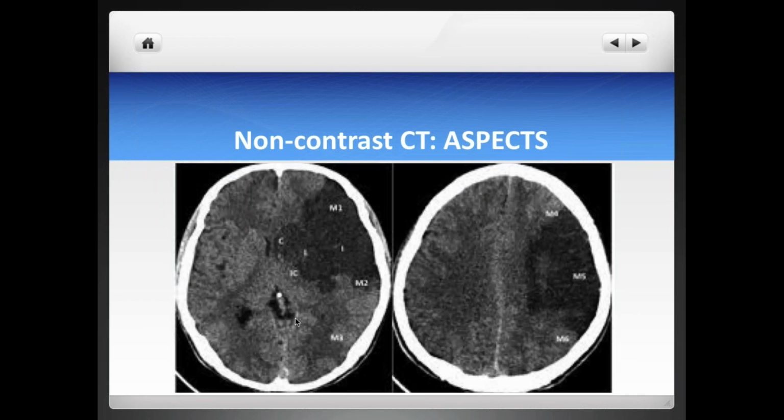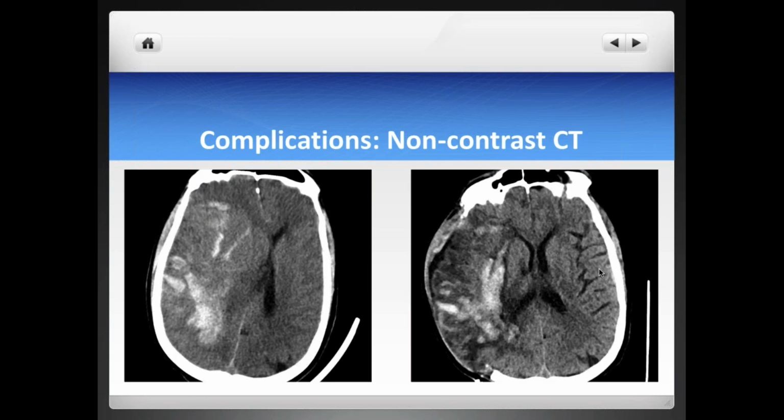On the other hand, we have this other extreme, a patient with a much lower ASPECT score. You already have a very well-defined wedge-shaped area of hypoattenuation in the left MCA territory, in which you have a very low ASPECT score, probably 2 or 3 only, with a very large part of the MCA territory infarcted, probably up to two-thirds in this case. So this patient is not a good candidate for interventional therapy.